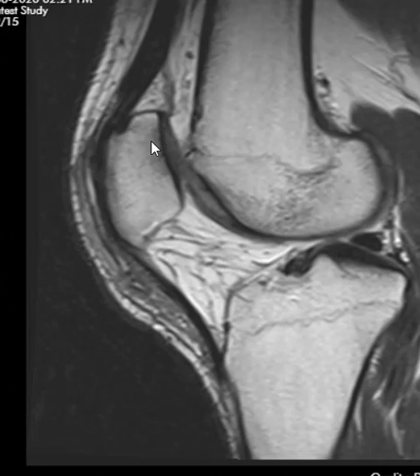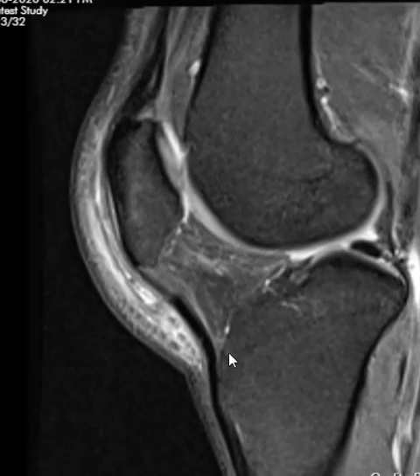If we look from the side, we see the kneecap over here, and the abnormal signal is in the front here. And now this view, it looks dark. And you can see the thickening of this dark area. This is the inflamed soft tissue. Now in this view, the abnormal signal is bright. Any inflammation or fluid is bright. So you can see how thick all this soft tissue is.